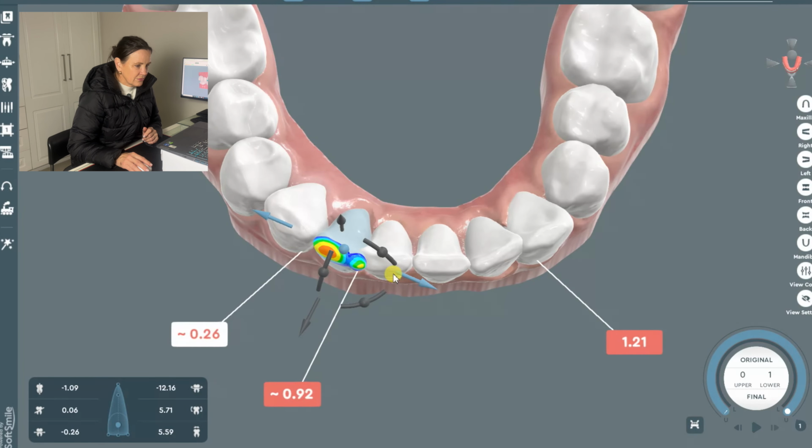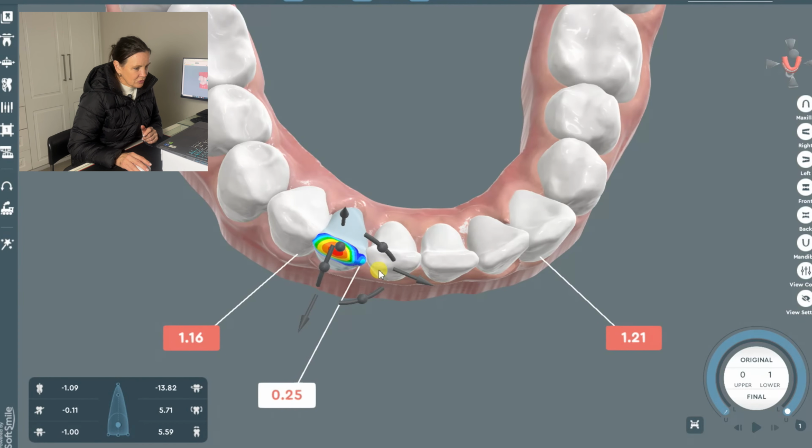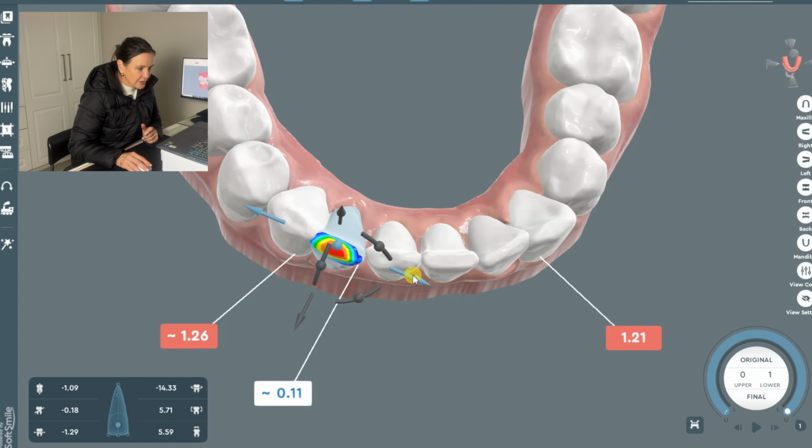Okay, so let's start doing that. Now I've established I'm going to work on interproximal stripping at the back. There are other choices we can do as well and see how it works out, but that's now our first choice.